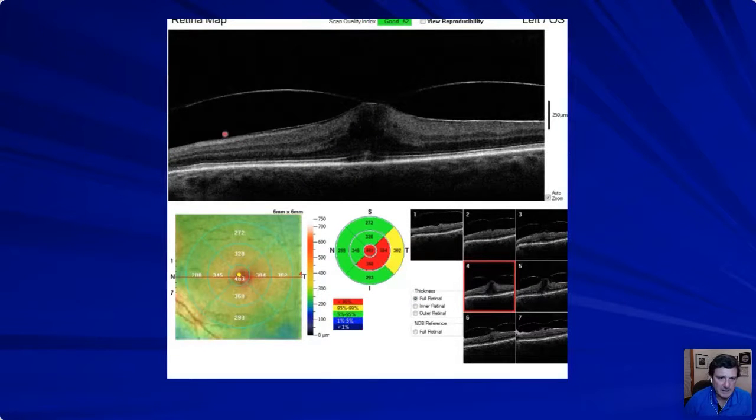And again, you can see here how the membrane is kind of still attached here. You have the vitreous separating out, and it's still intact. There's kind of that epiretinal membrane, that posterior vitreous, making that extra glue in there. And this one would be focal. But what I don't like is these mitochondria that are down in here in this ellipsoid zone, this inner segment, are starting to become a little fuzzy. I'm going to watch this one a little closer.